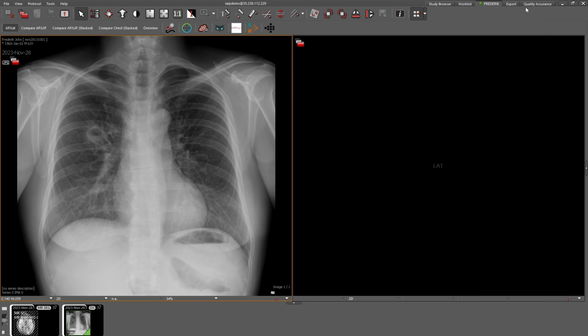Our patient, John, presents to the ED after waking up with left-sided weakness. His ED doctor orders a head CT, portable MR, and chest radiograph as a stroke protocol. The image is acquired and sent to Visage PACS for storage.